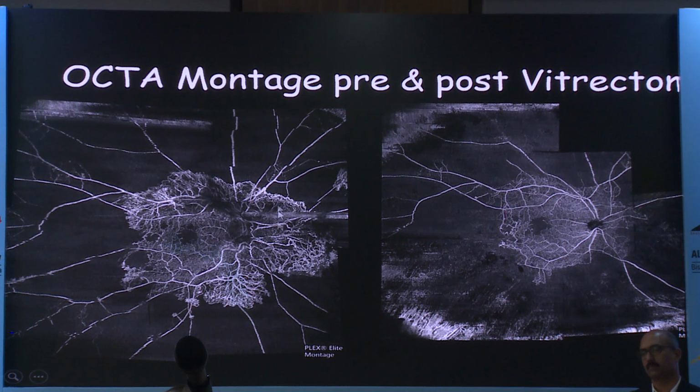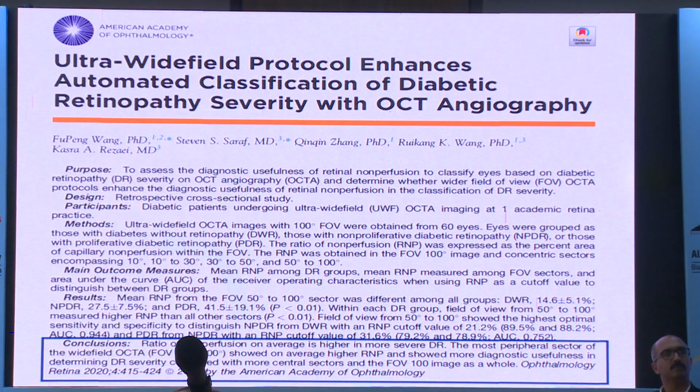So this was a patient who underwent vitrectomy with gas and bimanual membrane dissection. Pre- and post-op, you can see the entire thing is flattened and the retina looks almost normal. Of course, the perfusion is not there. And a tight laser, as Dr. Ajay just told us, is the key for long-term success in these cases.